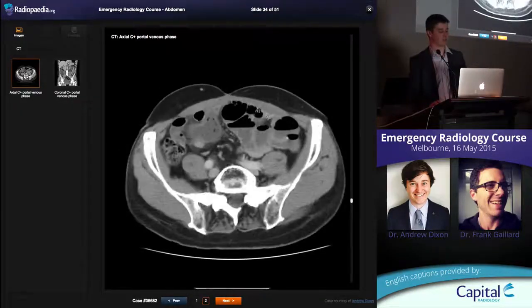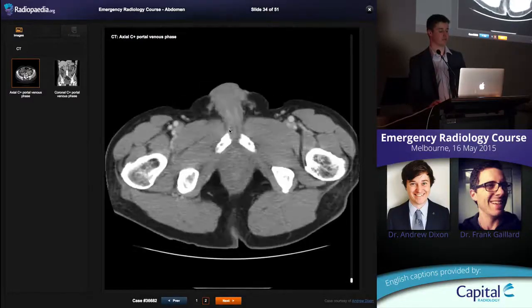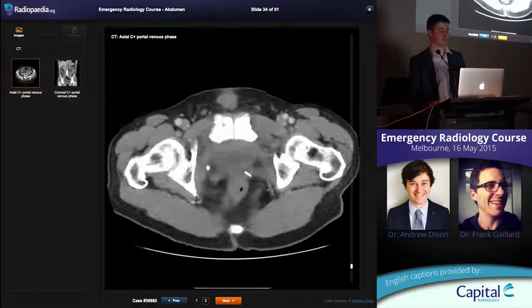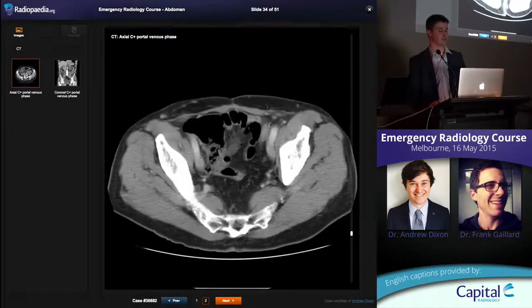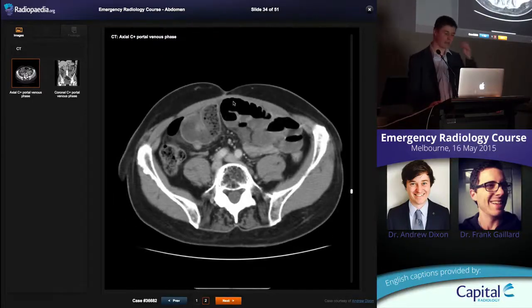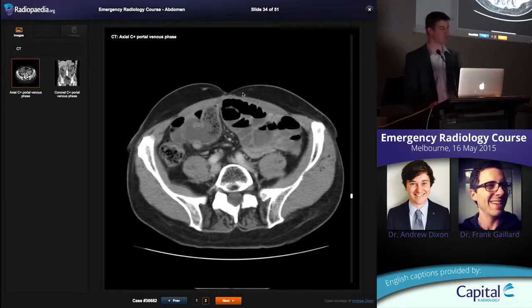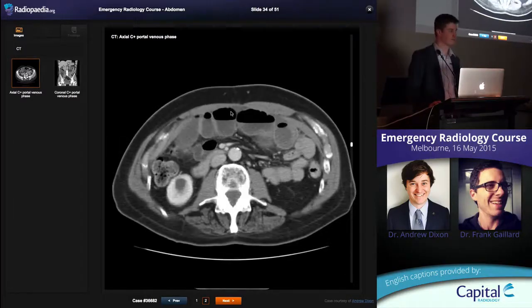Hernial orifices are a great place to look. Look for any umbilical hernia. Look for any femoral hernia. A little bit of fat coming into this right inguinal canal, but no herniation of bowel. There's funky little hernias like obturator ones, and that's not the obturator. That's the obturator. Spigelian hernias. So have a look for those. But then my number one tip: the patient who's had prior surgery, it's probably going to be an adhesion. Look for feculent small bowel.